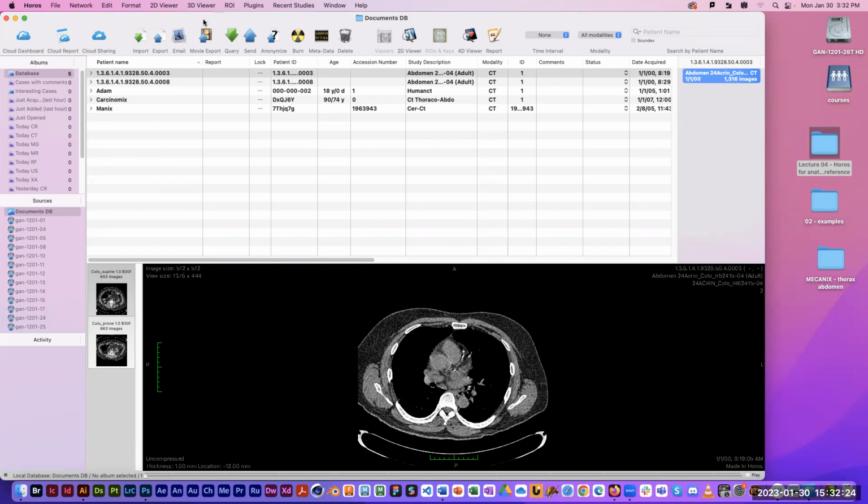And so first off, right off the bat, I was a little surprised to see that some of the data sets that I brought in here last time are still here. So I assume that means that these computers don't completely wipe themselves out and reset every single night. I'm not sure how frequently they do that, but usually I don't see the data here when I come back in after being away for a couple of days, but it doesn't matter.